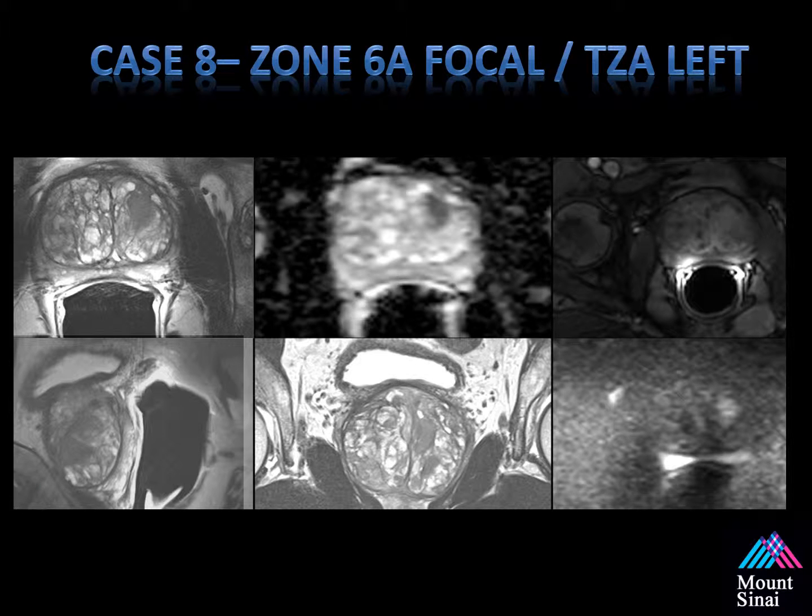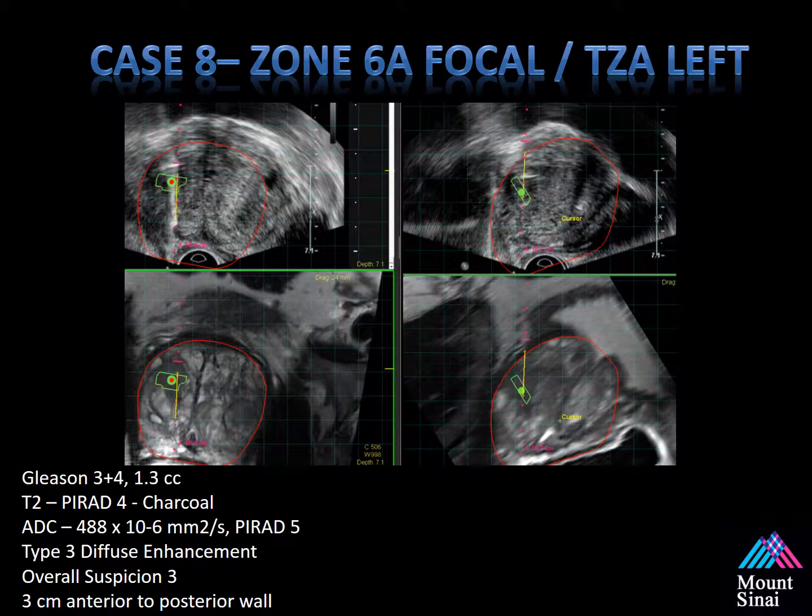As you move through these cases, I'm hoping it becomes easier for you to localize your eye to go to specific areas. It is difficult to interpret prostate MRI, but as a urologist, our expectations are that you're able to scroll through a sequence that's already been reviewed by the radiologist, and you can find and make sure that you're targeting the correct areas for your procedures.